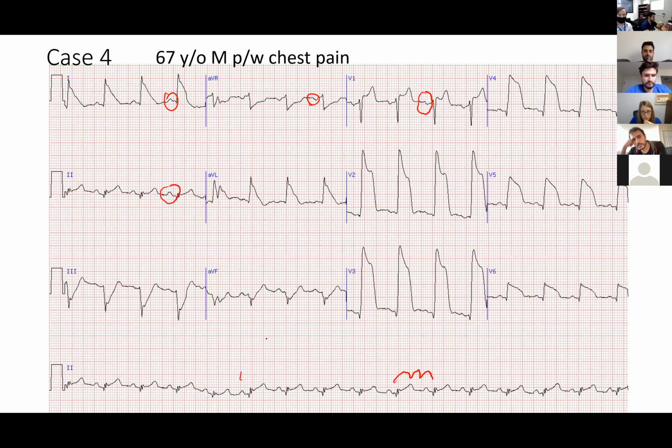And then when we get to the actual QRS, the PR length is normal. The QRS is extremely wide. I feel like this isn't just a QRS. I think it's eating the T wave. Exactly. You can see here how everything is getting merged. You should always look at all the leads when this happens because you're not really sure where the QRS ends, where your ST will start, which is why it's very important to always look at where your J point, the junction, is.